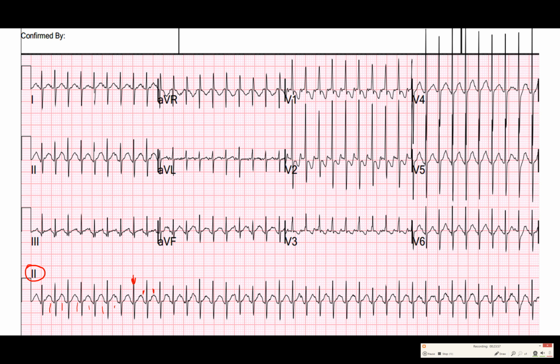And remember, we talked about atrial flutter. That's also a way that you could describe atrial flutter. If you had a tachycardia, you would say it's fast, it's regular, not sure I see P waves. So the clue for atrial flutter was, is it exactly 150 or close to it? And if it is, consider atrial flutter. In this case, we're saying the heart rate is about 180, so it's not atrial flutter.